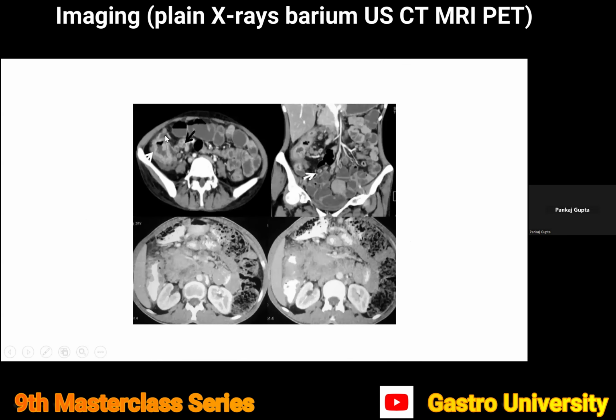So this was a patient with mural thickening and enhancement involving the cecum. Usually it has been reported that cecal involvement, if we consider that as a sort of colonic TB, will be contiguous with the ileum. So in the strict sense, it will still be ileocecal TB. But in this particular case, the thickening is extending to involve the ascending colon. We also see a lot of mesenteric and pericolonic necrotic lymph nodes. You can see the peripheral enhancement and central necrosis.